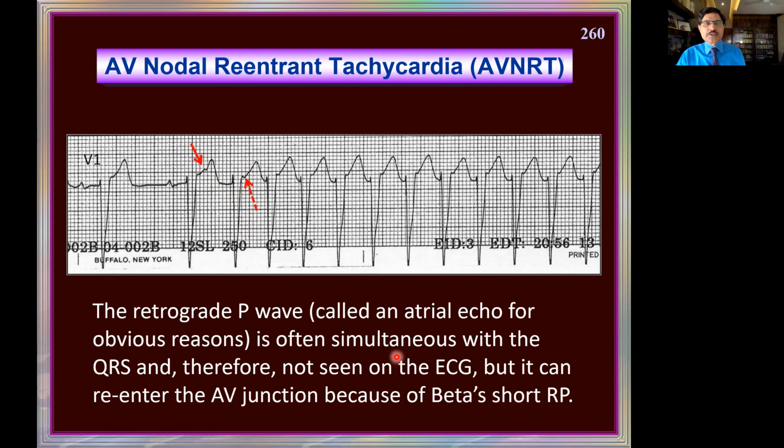Okay. So first of all, we have to find out the ventricular rate, and it is a regular ventricular rate, no irregularity, super regular. And there must be P waves which are seen, either not seen when they are in the QRS, or seen after the QRS, as similar monomorphic P waves. And this is the abnormal one which triggered all that.